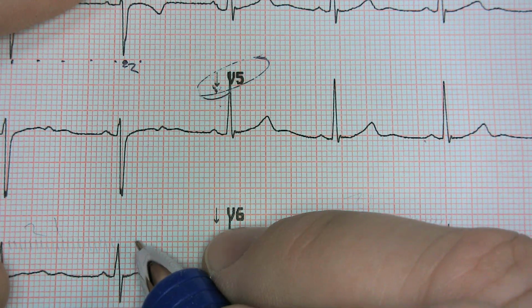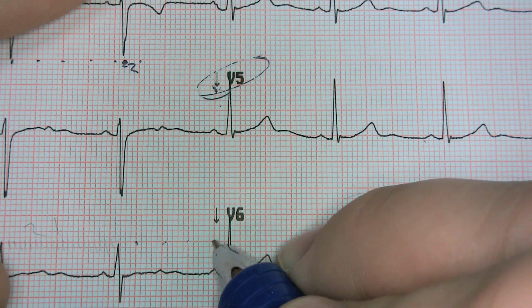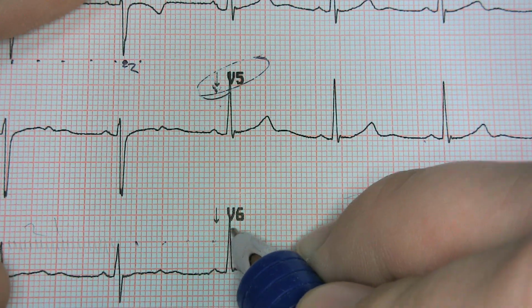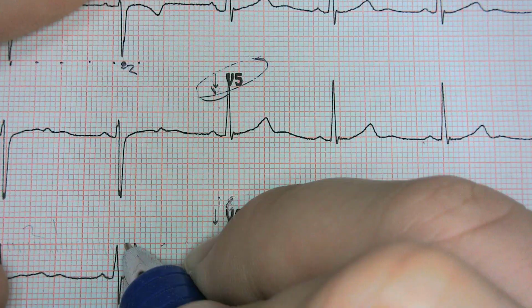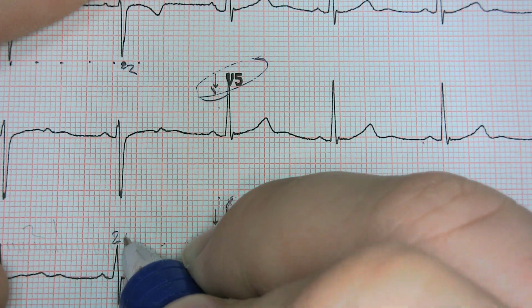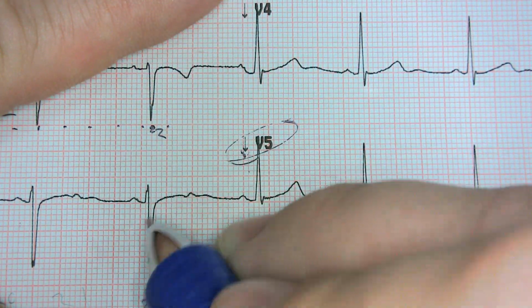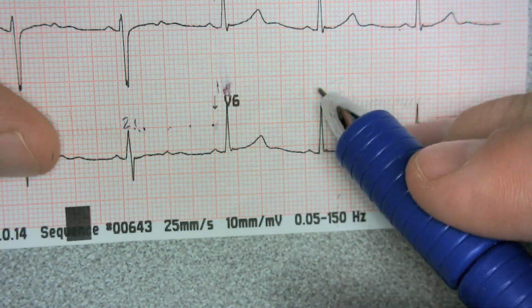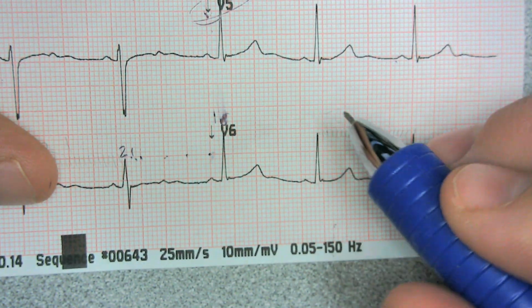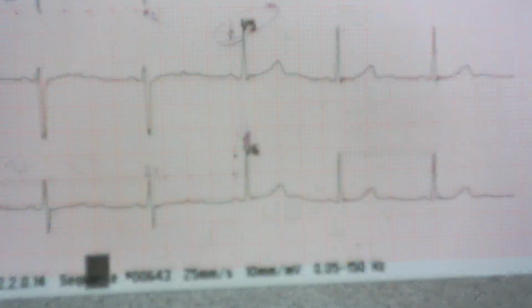So let's see right here. 0, 5, 10, 15, 3 in. We're at 18 to get to that peak. 19, 20, 21, right? And even if we did over here, that'd be 22. We're still well within our zone. So it doesn't look like it's going to hurt anything, right? So 21.